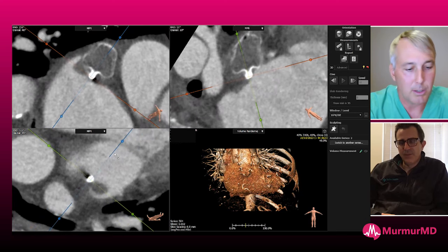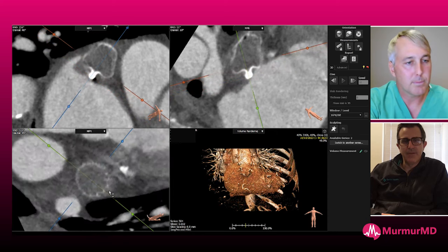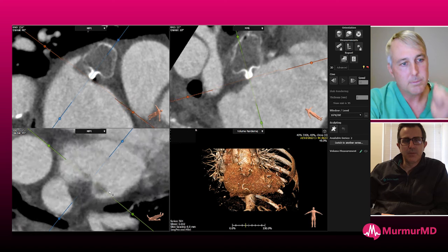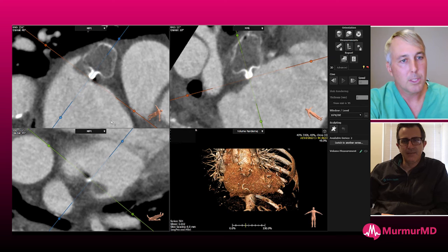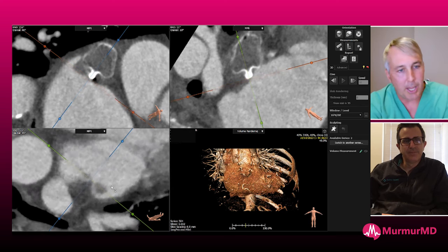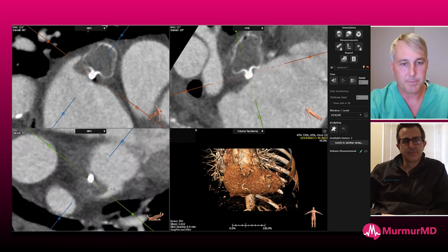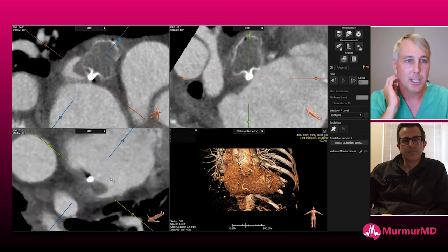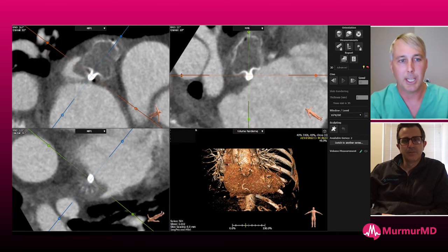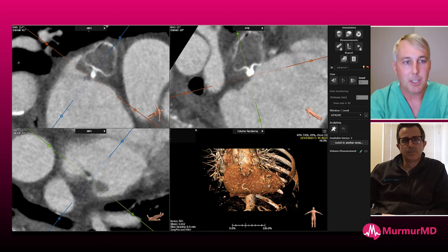I think that the more CTs we've done, the more stuff we see. Sometimes you see some stuff that maybe you need your level of expertise to discern. Because I think some programs would have called that first case thrombus, but your explanation makes perfect sense. I think it's just trapped behind. You'll see that. I feel like we see that all the time. Someone calls it thrombus, and it's like this little very smooth dome that forms on top of the device. And if you go back to the TEE during the case, almost always they'll have that oscillating fabric. It's just the device is compressed or there's a leak, and it's causing the thrombus to form under where it kind of puckers up.